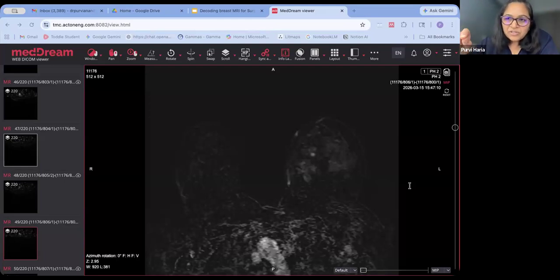If I have a duct filled with hemorrhagic fluid in its entire extent, and I give contrast, the duct is probably not enhancing. But if I'm seeing only these images, I might consider it a linear enhancement and call it a suspicious finding, whereas it was just an inspissated secretion within the duct, which is a totally benign finding.